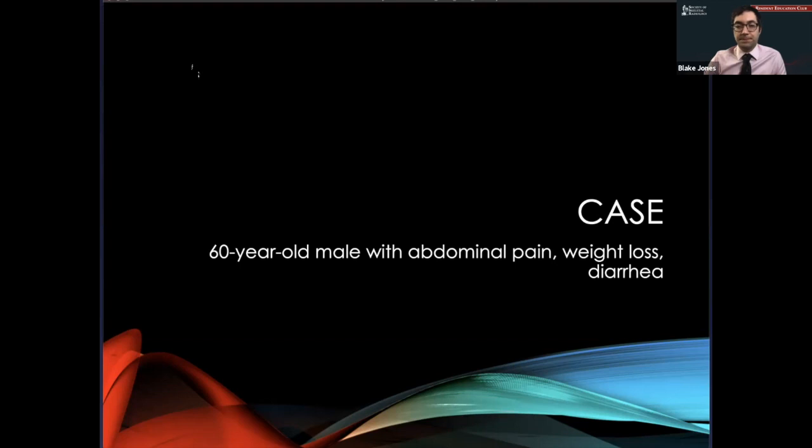Is the low ADC value, does that increase your suspicion for malignancy because of hypercellularity in particular? Yeah, as far as I know, I think that's the purported mechanism of that. It sort of connotes the lesion as more cellular.